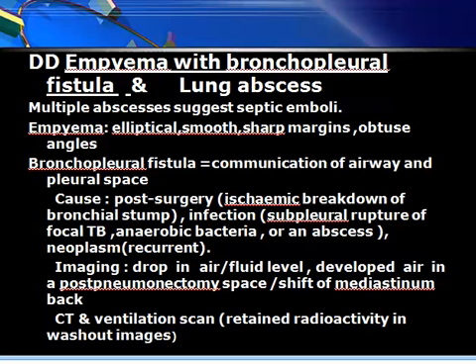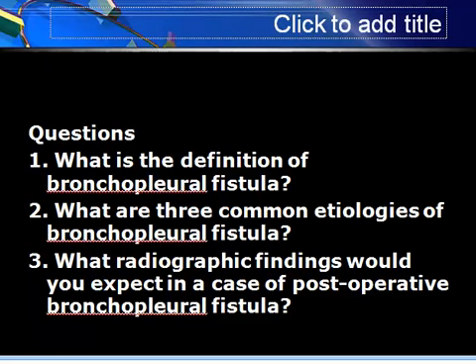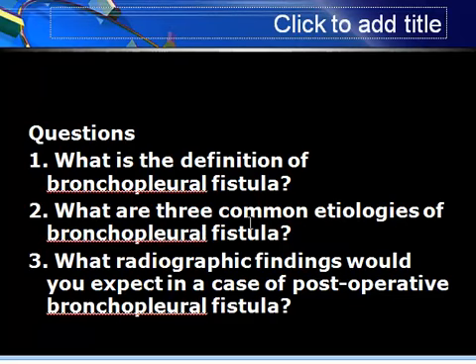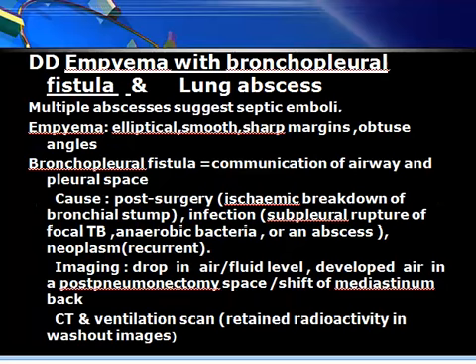indicative of bronchopleural fistula. What is the definition of bronchopleural fistula? Bronchopleural fistula is communication of airway and pleural space. What are the three most common etiologies of bronchopleural fistula? The most common etiologies are post-surgery, infection, and neoplasm. Post-surgery, infection, and neoplasm.